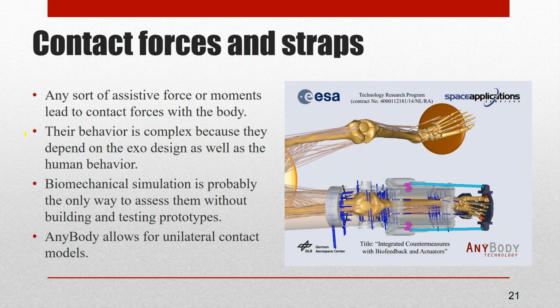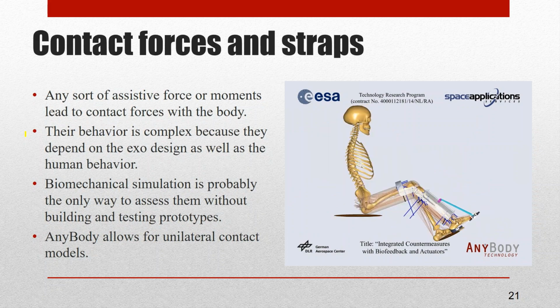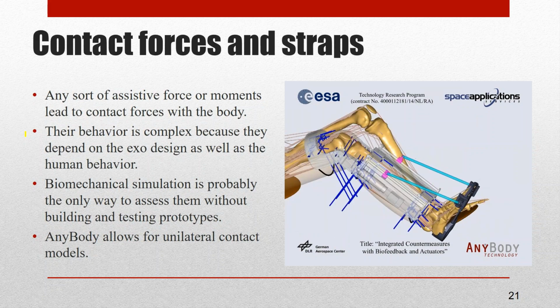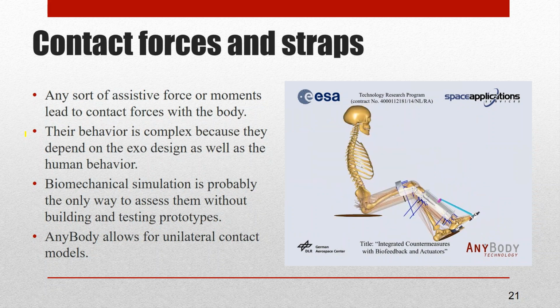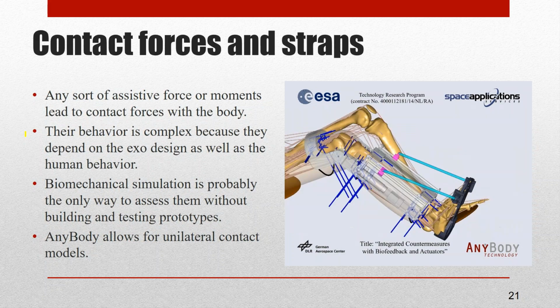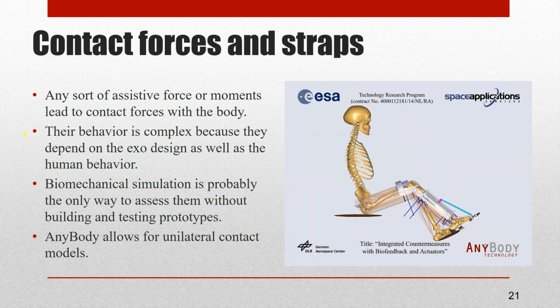I want to talk a little bit about the contact forces, because one important element in the contact forces is the ability to model contact properly. So contact, as you probably know, is a very nonlinear mechanical thing when we talk about unilateral contact, and that is also the case with exoskeletons. So the contact forces of the exoskeleton are going to shift from one side of the body to the other, typically when the exoskeleton is exerting forces in different directions. And obviously we have to model that properly.